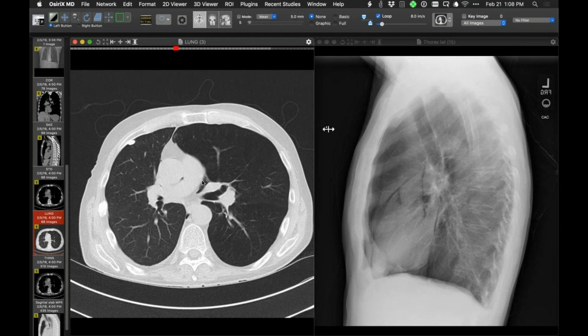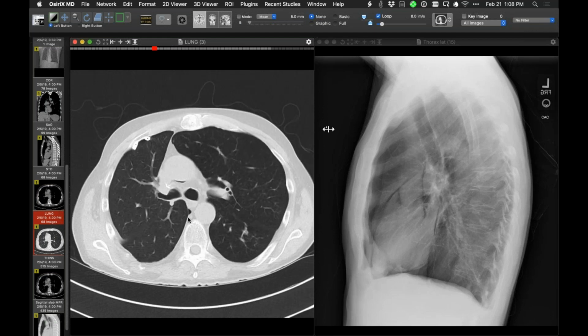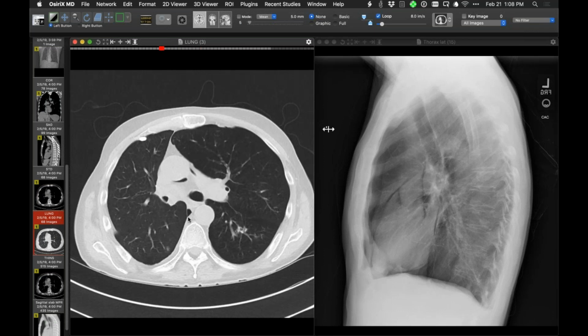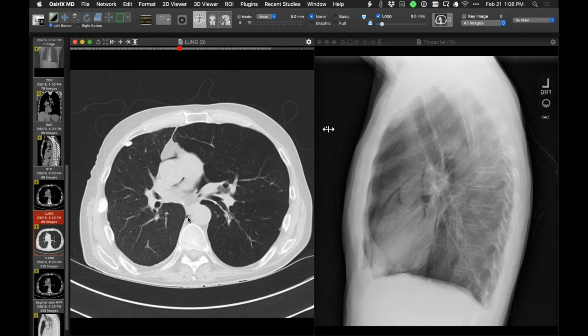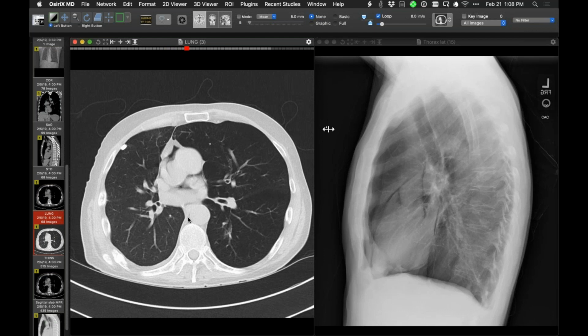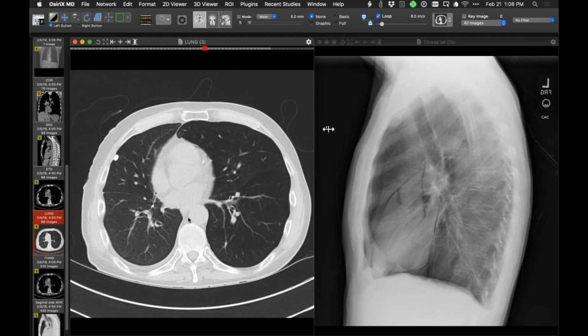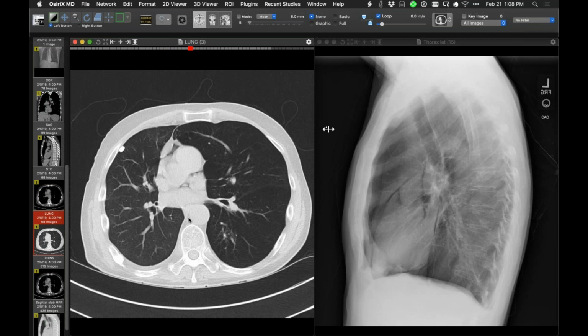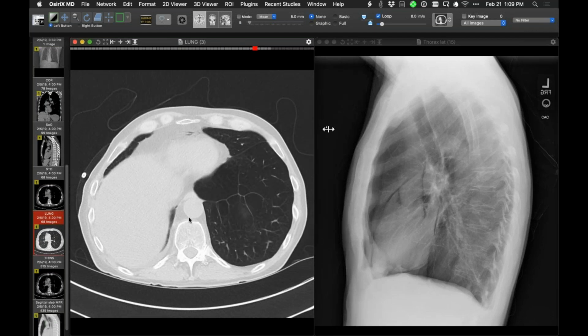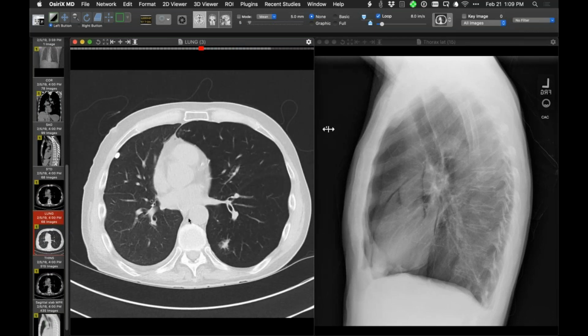This could be a pericardial recess there too, actually, now that I think about it and look at it again. This one maybe not so much, a little, well, this pleural space. Right there, scroll down a little, Howard, the image where it's more vertical or horizontal, right there, that's the transverse sinus. That's the portion of the pericardium that connects the aortic recesses to the rest of the pericardium. Okay, so most of the pericardium. Pericardial recesses rather than Pneumomediastinum. That's a really good thought.